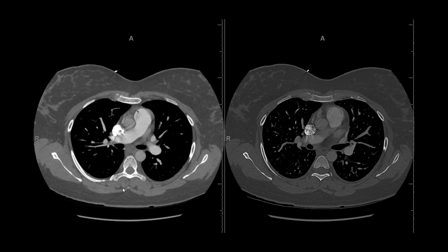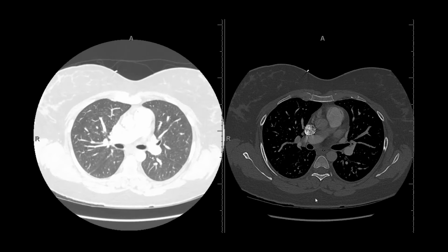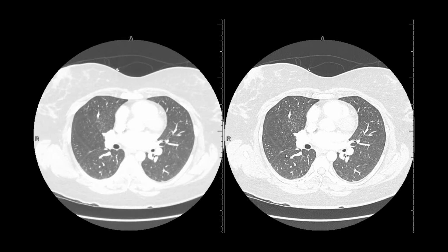Now, from these algorithms, you can choose how to display the images. You can manually window and level the scan to highlight certain anatomy. Most programs come with pre-existing presets for these algorithms. So if I'm going to look at the lungs, I'm going to have a lung algorithm like this. And when you look at the lungs, you will see that, as I zoom in, the lung algorithm CT will have sharper lines and give higher detail of the anatomy. This is something you see throughout CT scans of the body. We have different reconstructions of the area coming over as different scans, even though the patient is just scanned once. And then on each scan, you have the option to window it to whatever it is you're looking at.